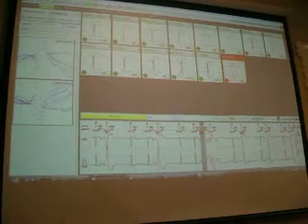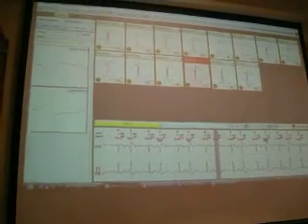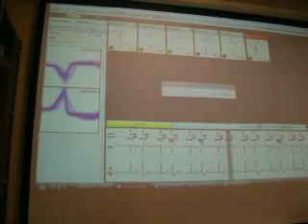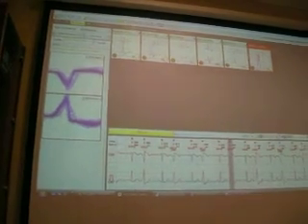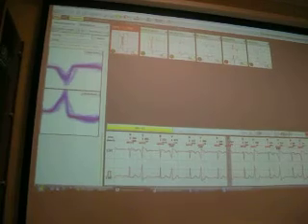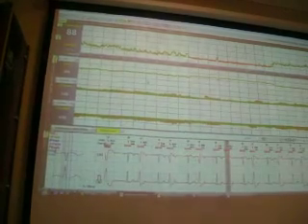And this is the last point. Update changes and auto merge. Auto merge, and the software merged the similar clusters into one cluster. And I am ready with the template menu.